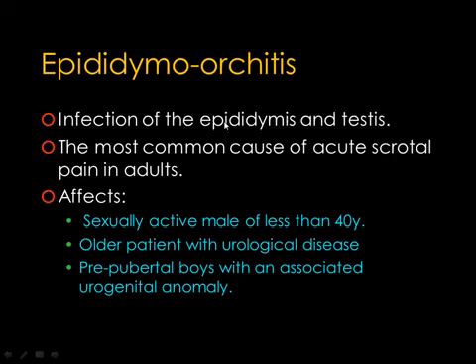Epididymo-orchitis. Epididymo-orchitis is infection of the epididymis and testes. It is the most common cause of acute scrotal pain in adults. It predominantly affects the sexually active male of less than 40 years, the older patient with urological disease, and the prepubertal boy with associated urogenital anomaly.